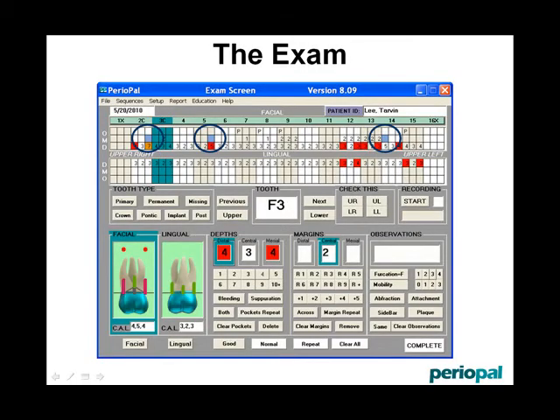If the selected value is recorded during the course of the exam, PerioPal automatically generates precise on-screen displays and report images highlighting the predetermined guideline for therapy. PerioPal offers the complete tools to diagnose and educate patients, as well as motivate them to accept treatment.